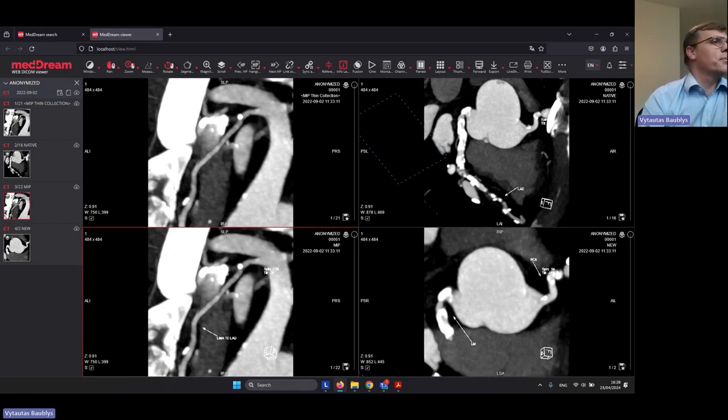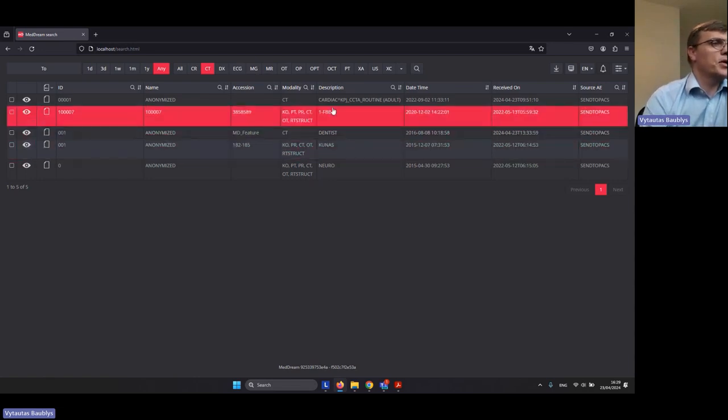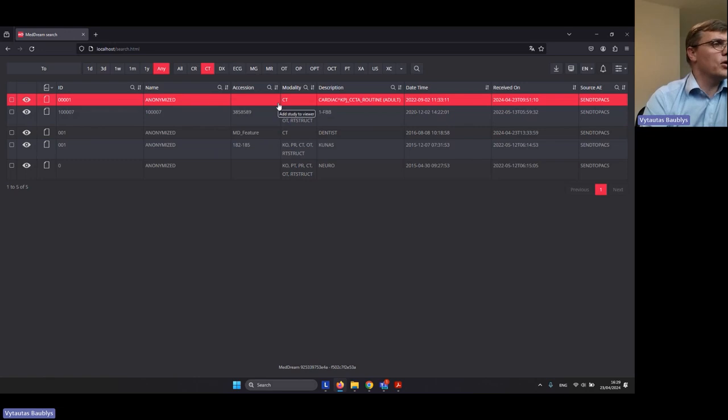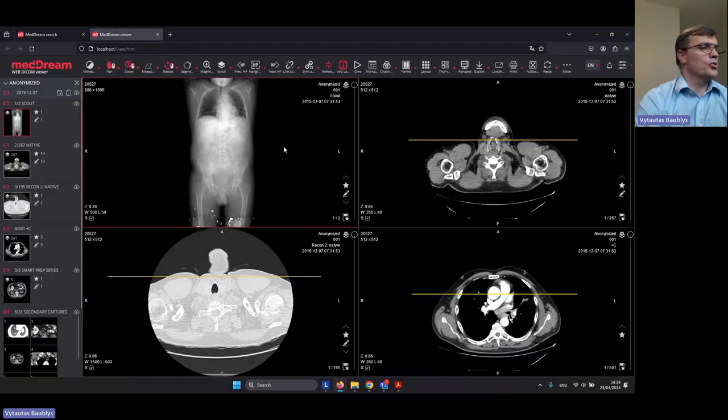Now I go to my most beloved feature, which I dreamed of for so many years, I would say all 18 years, because as I said previously, I worked with merge systems, and on them it was a standard function to have curved MPR. I really wanted to achieve this with our technology, and finally we have a full implementation which allows us to show MPR.